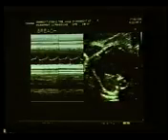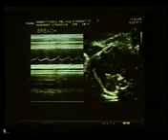Okay, so color Doppler, echocardiography, and M-mode. I guess because of the time constraint, I want to go to the other portion of my fetal echo. But just to tell you, M-mode is part and parcel of your fetal echo. You know why? I'll tell you the reason in a minute. There you can see, can you see these dots here? We don't look at them.